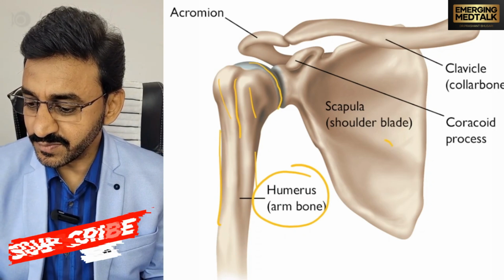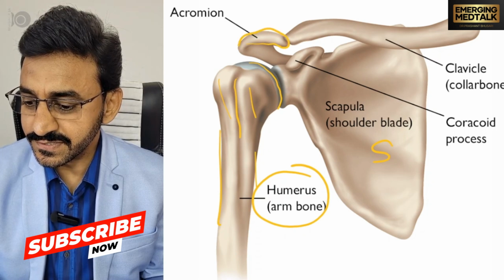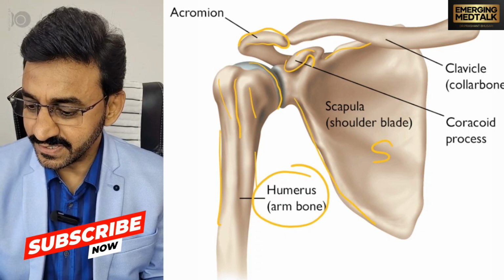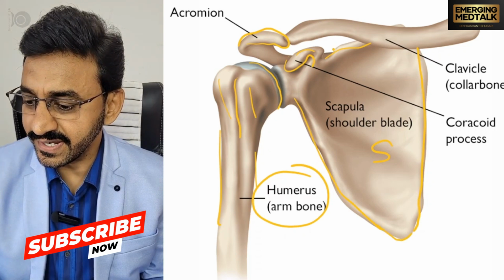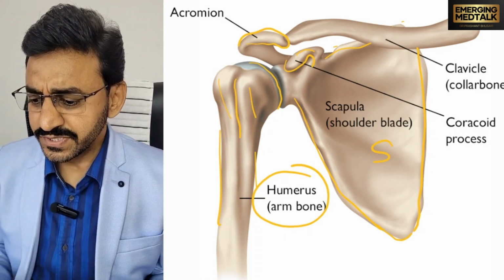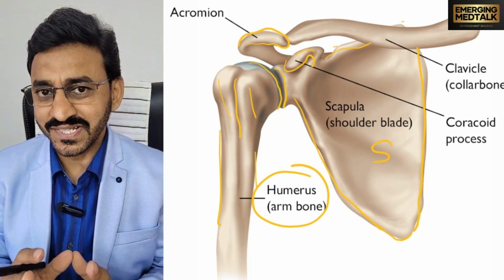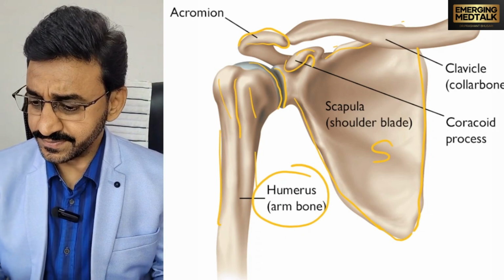This is the scapula, and we can see the acromion process, the coracoid process and also the spinous process. Here we can see the lateral border, the medial border along with the inferior angle, and above, the superior border along with the superior angle. So this is the scapula. Very important is the glenoid fossa or cavity of the scapula, articulating with the head of the humerus.